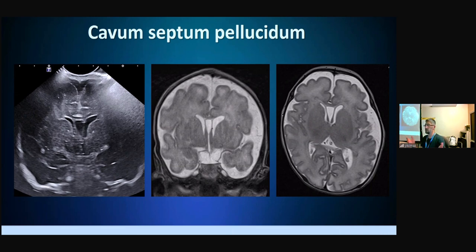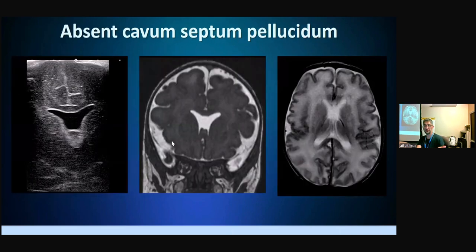So the obstetricians are obsessed with this cavum because if they don't see it, they think that there may be some other midline anomalies. So when they see this, they feel good, okay, there is no other midline anomaly that I'm not seeing. That's why. But after birth, they don't mean anything. They usually disappear after 6 months. I mean, these two membranes merge, so they form the septum pellucidum. It's just a normal structure.